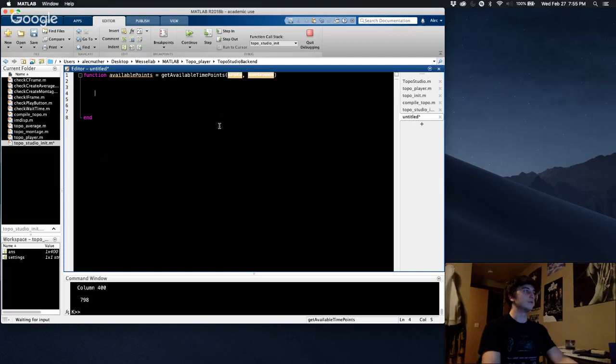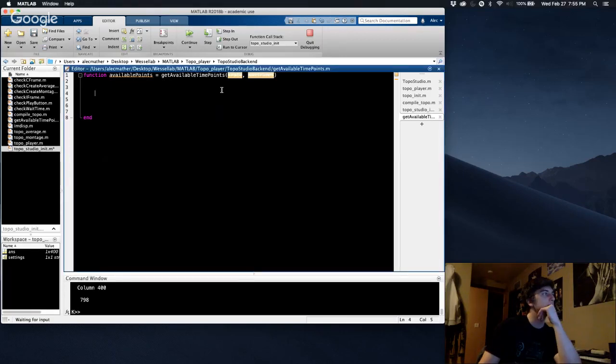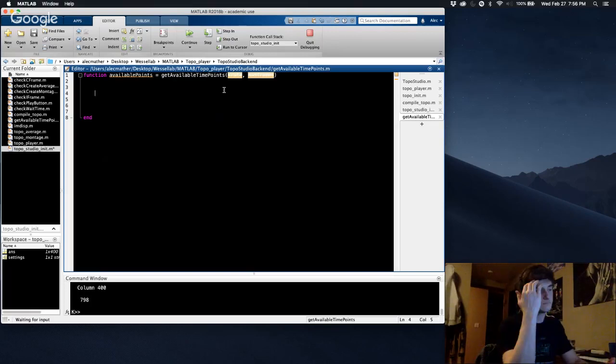Okay, so what we need to do is we'll use this to post studio background. This doesn't really matter. We'll play here. No, it'll be in a studio. So what this is going to do, it's going to take your sample rate, and it's going to go... let's see, how's this going to work? There are available points.